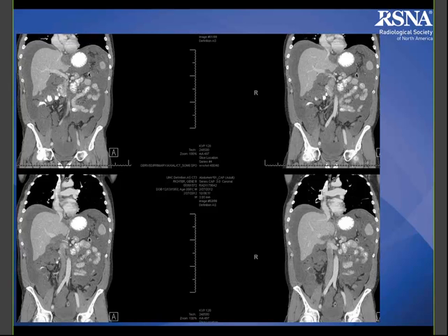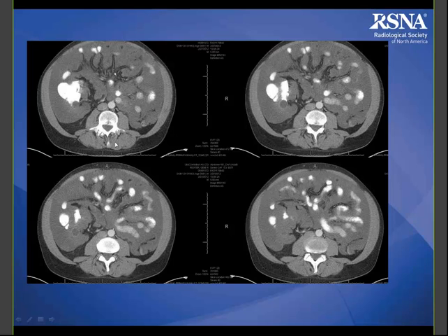And if you're looking at this, you're thinking there's a lot of ascites. This is true. And one thing that I might point your attention to is this very small structure. And this was really tough to call, and I'm not sure if it was really well noticed on the first scan, but you see this partially calcified, somewhat tubular structure down here in the right lower quadrant. This patient had oral contrast, and you can see this tubular structure with a thin peripheral wall to it, dilated, and that ended up being the appendix that is clearly dilated.